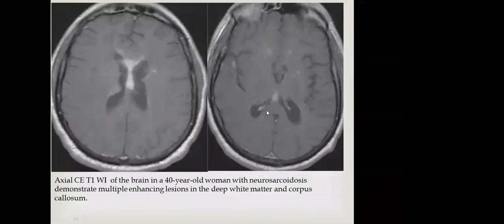This lesion demonstrates multiple deep white matter lesions, also seen in this case with homogeneous enhancement, regarded as neurosarcoid.